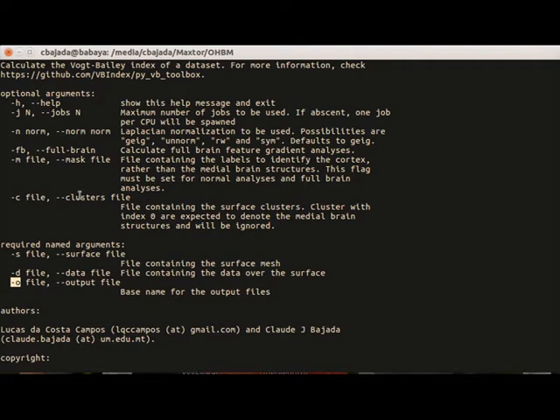And then we have a bunch of other optional commands, some of which are needed for certain analyses. There are 3 main types of analysis that can be run. The first type of analysis is the so-called searchlight VB index. That runs a searchlight and outputs a map which you can sort of think of as an edge detector. More details are in the preprint. I will not go into exactly what the code does and what the meanings of the maps are, but if you go to the preprint and find the searchlight VB index, that's one of the analyses that you can do with this software package.